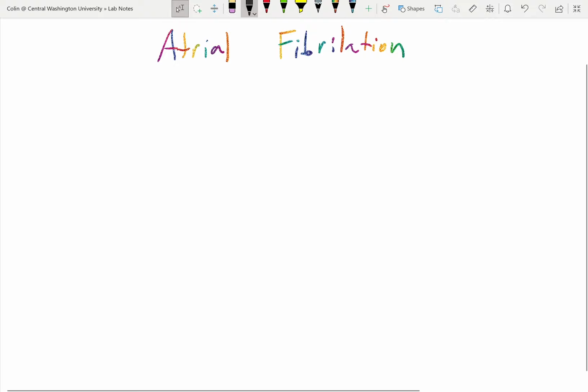Hey guys, so for this video we're going to talk about Afib or atrial fibrillation. One, how to recognize it on the 12 lead, and two, we're going to talk about the dangers and the risks associated with it.